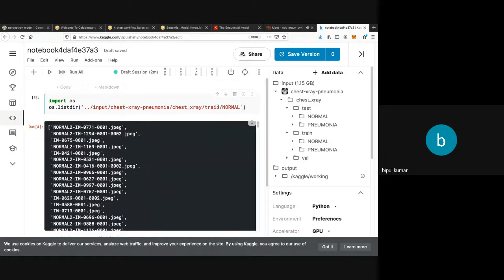These are the different files, different images. Those images we have to read. Correct. So once we read the images, only then can we create a data frame. Correct. So how can we read the image? Already I told you we can read the image with the help of CV2, isn't it? That means these images we have to read one by one to create a data set.